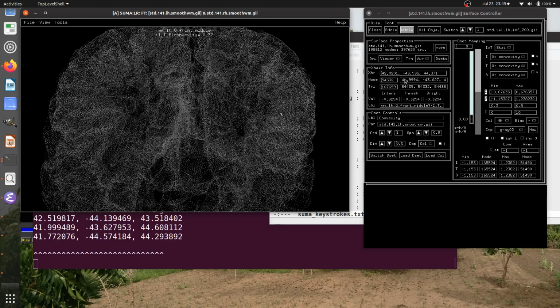Everywhere I click is defined to be in a particular triangle. So here, every triangle has a number, and every triangle is made up of 3 nodes. So these are the node indices. You can see the one that I've selected is one of these. This is the XYZ location of the node, not just my crosshair, but the node on the mesh. And we can see the coloration. Here's the label. Okay, so this is telling me about where my crosshair is.